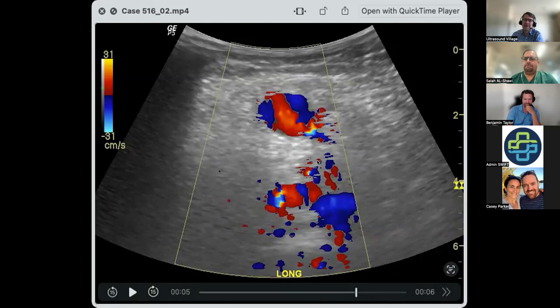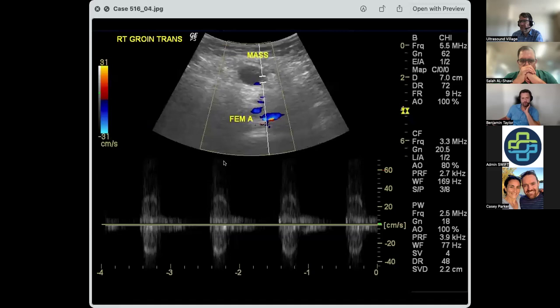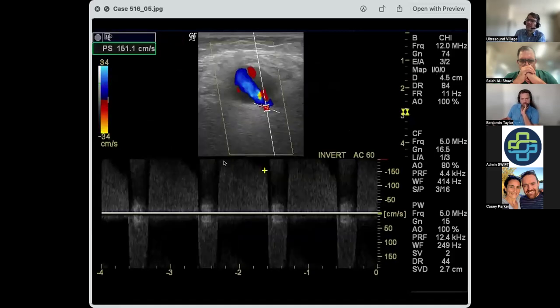And this is called the neck, obviously. All right. Sorry, we'll just go through that. As I said, you haven't had the lecture on this yet, but does anybody want to comment on what that spectral Doppler is showing?